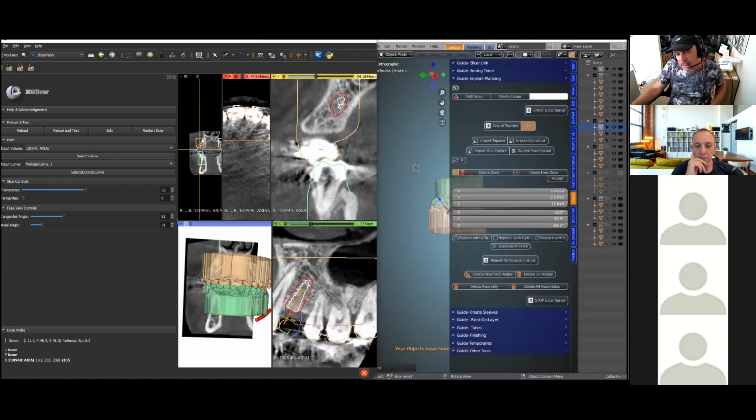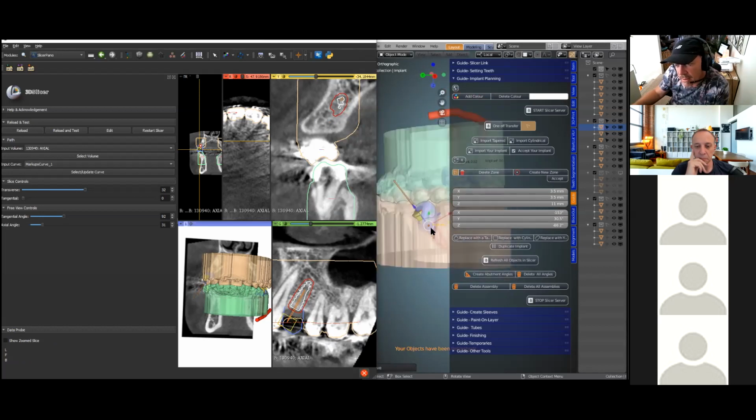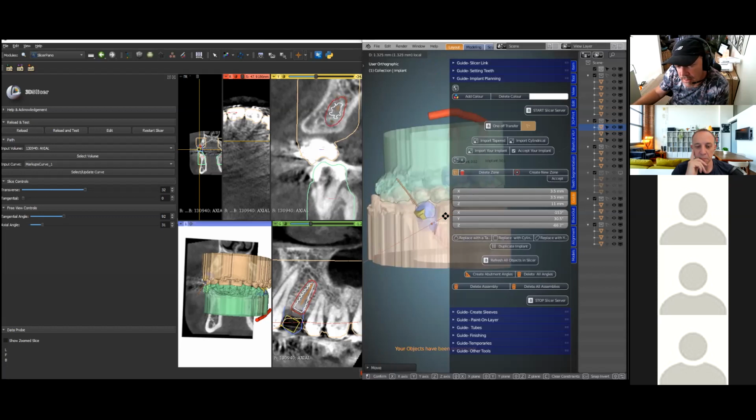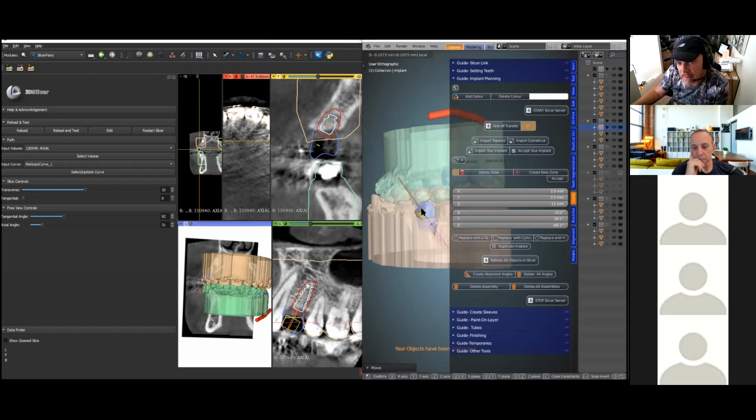And then I can see the yellow sleeve is hitting directly into my tooth. And you can see that over here as well. So let us pull it a little bit over across something like that, so that we can sort of get into the middle, and maybe shift it a little bit along the Y. So we're just double checking it all the time, and maybe down a little bit.